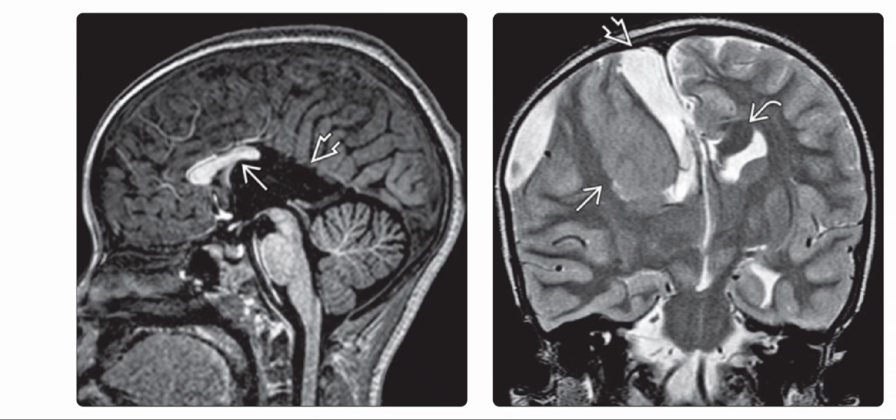The image on the right is the coronal T2-weighted MRI, and it shows the agenesis of the corpus callosum with shunted interhemispheric meningeal cysts. Also note the massive nodular heterotopia on the patient's right. A Probst bundle has formed on the left but not on the right.